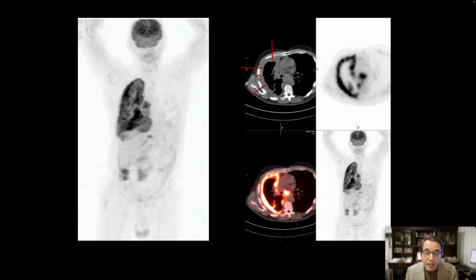There are some calcifications also, and this thickened pleura shows intense hypermetabolism. There is some subcarinal focal uptake from metastatic lymphadenopathy. So this patient has mesothelioma because there is diffuse pleural thickening, and that thickening is hypermetabolic. Of course, they need a biopsy to make the diagnosis, but FDG PET-CT is good for staging the disease.